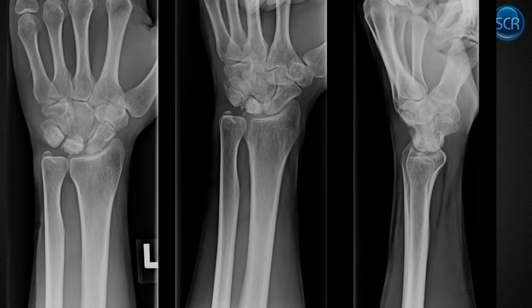Here's an example of a wrist where we've got a sclerotic lunate. It's getting fragmented, irregular. We can see that fragmentation of the articular surface. And so this person has Kienböck's disease. So they have AVN of their lunate. What could this be caused from? One of the common causes is negative ulnar variance, but they don't have that. They actually have a little positive ulnar variance. Other common cause is lupus on steroids, but any of our usual risk factors for the AVN differential fits.